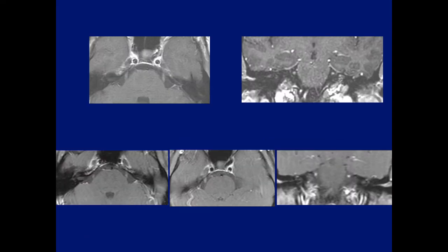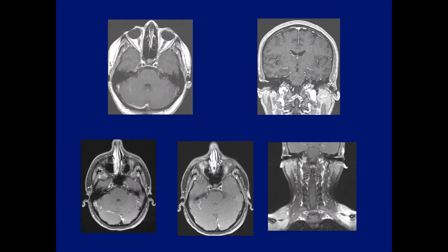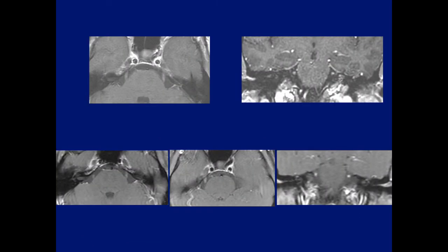And that's the issue. In the lecture I put the abnormality right in the center of an enlarged image so it's easy to see. But in actual clinical work, we are faced with these images, and many times we will not see unless we know where to look. So it's important not to be too critical on some of the misses, because in the busy clinical work, these very small abnormalities may not be seen.